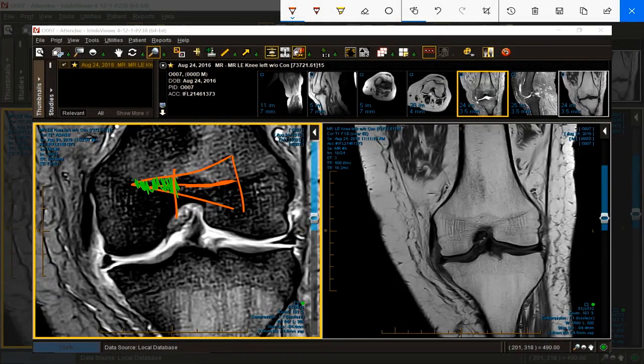I have not done an MR knee arthrogram for this purpose in 10 years. If this is a symptomatic remnant, then it is going to be extruded, flipped, twisted. It'll have a cyst. It'll be inflamed. It'll be gapped. But it won't have a simple linear or oblique signal that is symptomatic or needs to be addressed. Because 95% of the time, people that get meniscectomies that have symptoms, it's related to this, chondromalacia.